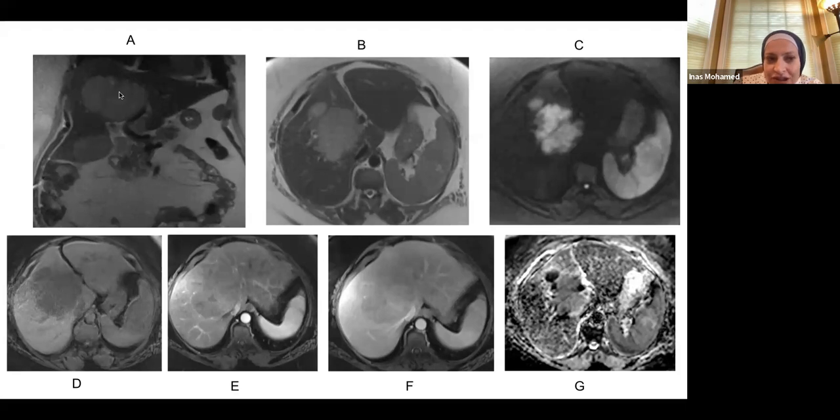So it's not just one lesion. And T2 slightly hyperintense, and look at the diffusion here and look at how it's enhancing. And there is another subtle finding in the images. If you can see it, you will get the diagnosis, but a subtle finding outside of the liver. Okay, I'll give you a second to look at it.